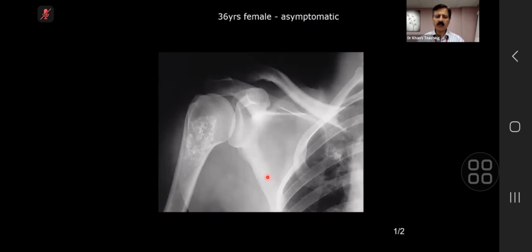The theory behind it is that with enchondroma in the long bone, you might not see any lucency. Enchondroma in the short bones of the hands, for example, you will see lucencies, right? Here you might not see. The only key is the chondroid matrix, which is classically defined as rings and arcs and nodules, right? And as I told you, if it is serpentinous, then that is a bone infarct. That's different radiology.